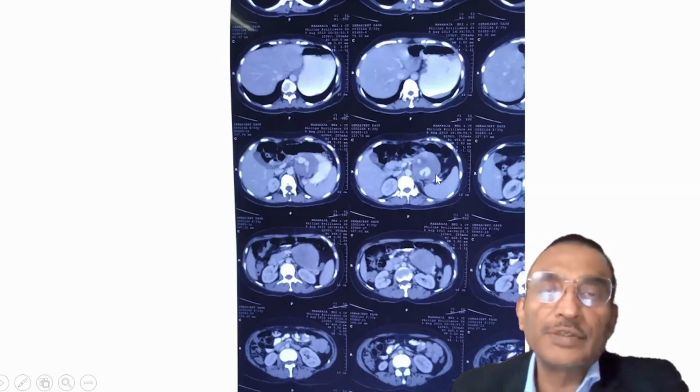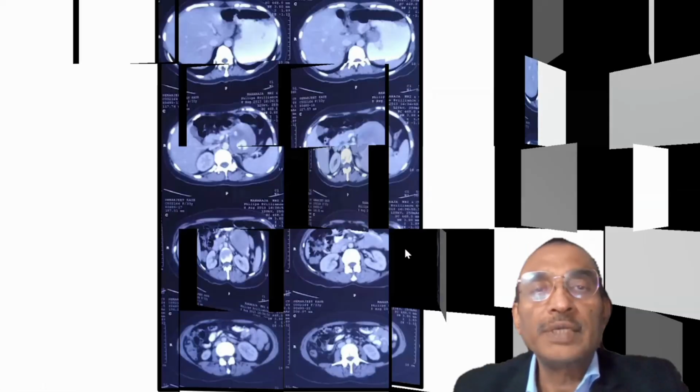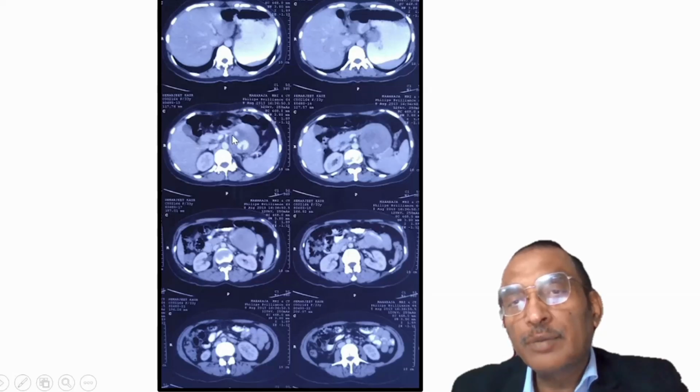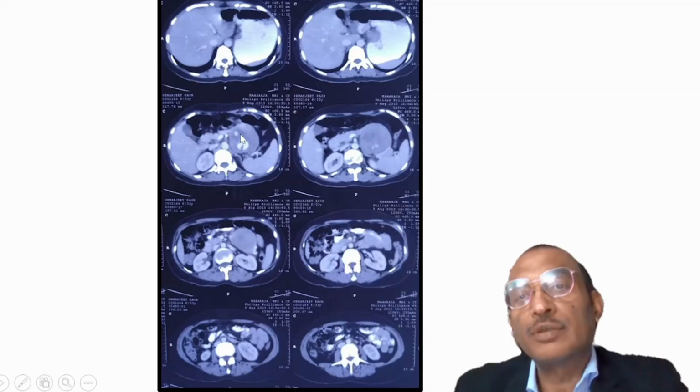So this is actually a pseudoaneurysm inside a cyst. So one with pseudoaneurysm, that should be always clearly understood. And what you see here, you have a different content. Here you have a hypodense content. So there is a pseudoaneurysm which is partially thrombosed. So this is not enhancing because of less dense clot out there.